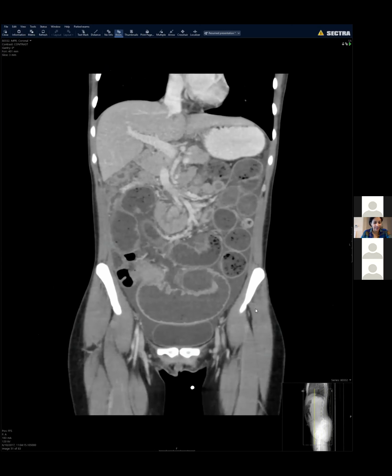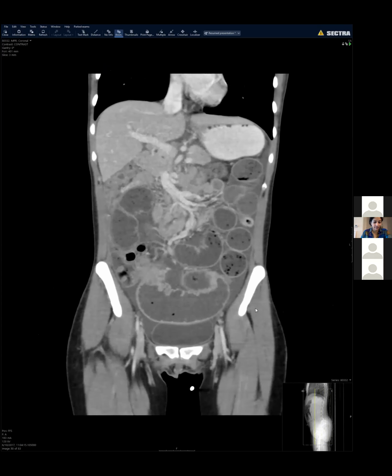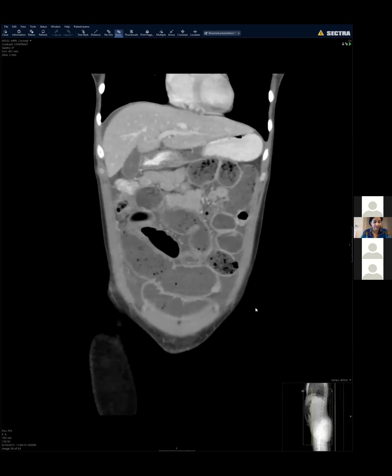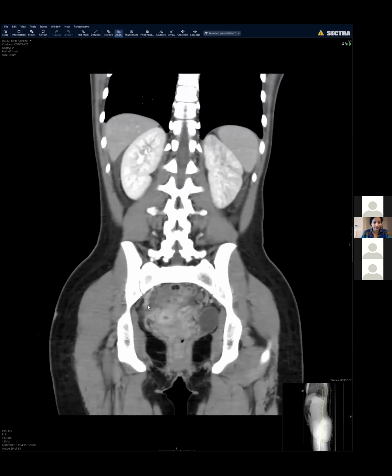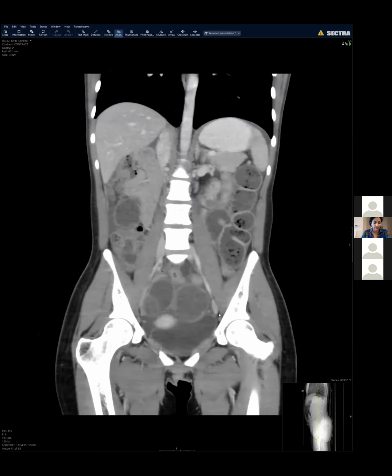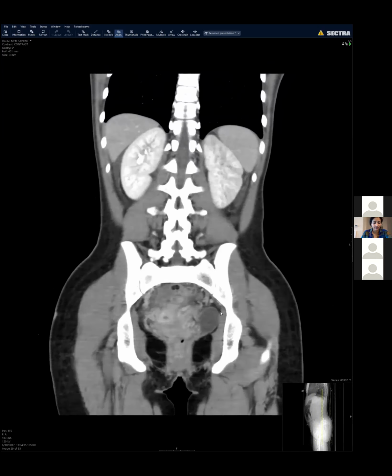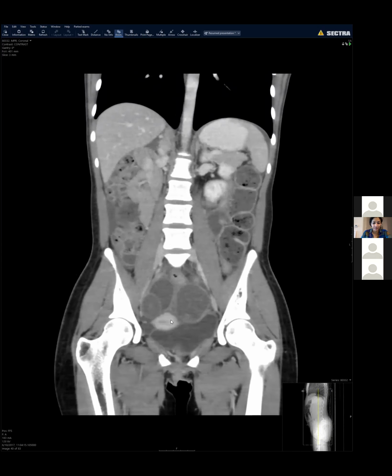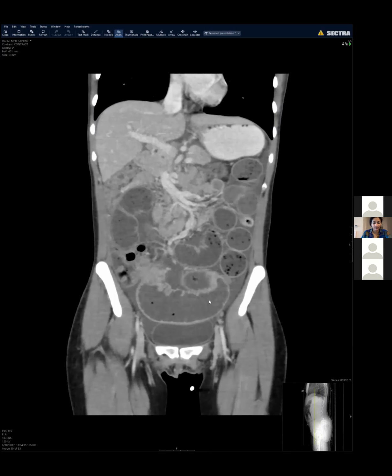Yeah, great case. But at surgery, they did find extensive adhesions. And interestingly, they said the serosal surface of the sigmoid and rectum and all other common places where you would find endometriomas were all clear. So bilateral adnexal masses, and like we always say, when we see bilateral hematosalpinges, that's a presumptive sign of endometriosis anyway. So using narrow window settings, putting together the ovarian findings with a small bowel finding just makes for a good case.